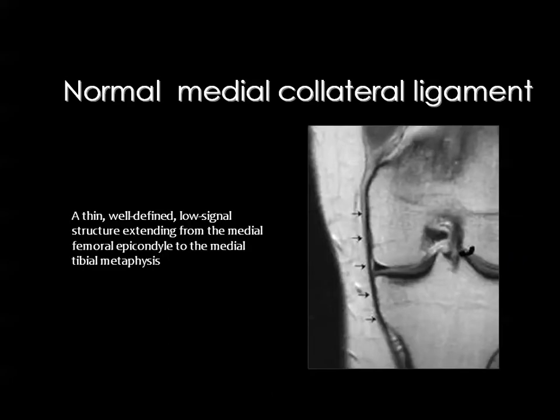Then if you look carefully here, this is the medial collateral ligament, and you can know that this is the medial one by its close proximity to the femur and the tibia.